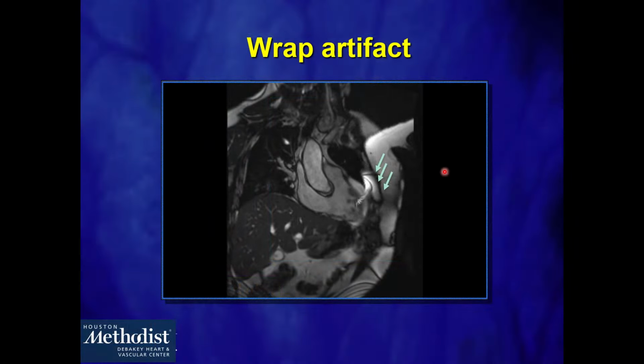So this is a very wide field of view. This is going to be a coronal image. So you see the ascending aorta. And what's happening over here is that the opposite subcutaneous tissue is wrapping around the heart. I don't know if you appreciate this over here, but that's not a normal structure, because the field of view in this case, I've set to be smaller than the whole extent of my radio frequency pulses.